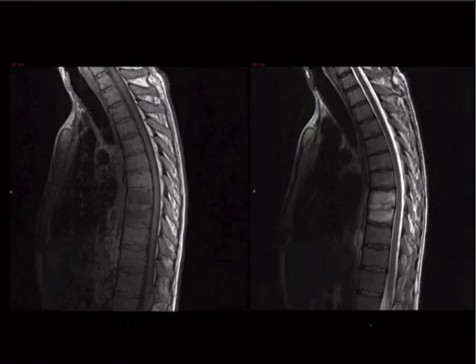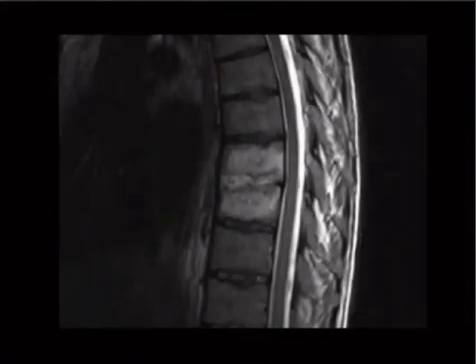We've got 2 different MR images here. One that's T1 and one that's T2. I'll zoom in here. And you're probably thinking, well, okay, so the marrow is involved and the disc is involved. It could be infection, could be maybe cancer, it's just mets. I will tell you that metastatic disease to the disc never happens, in quotation marks. This is, at least for the purpose of multiple choice. So when you see something like this, I want you to look straight at the disc.